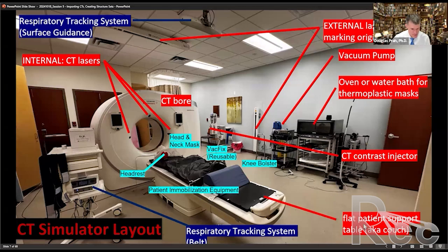We also would like to point out that the couch on our CT scanner is flat because our treatment couches are flat. So this is where we differ from radiology. Radiology typically has a curved couch. We will have a flat couch in our treatment units. We do a lot of contrast injections for certain scans when we're trying to identify certain vessels. The other thing that we have in the room is an oven or a water bath, and we will use this to help form masks or other thermoplastic devices that we may be using.